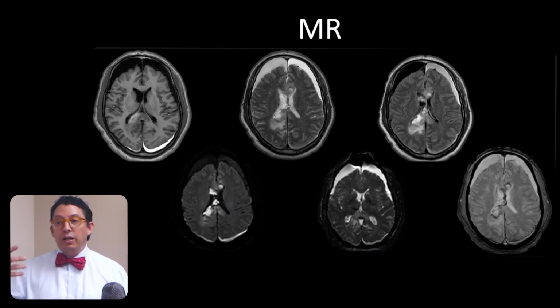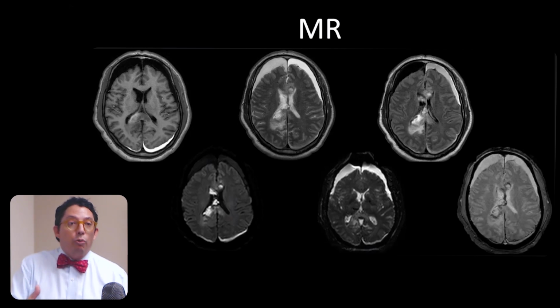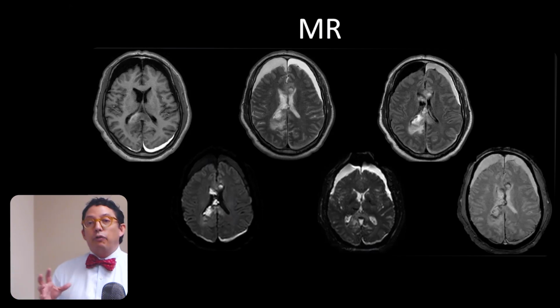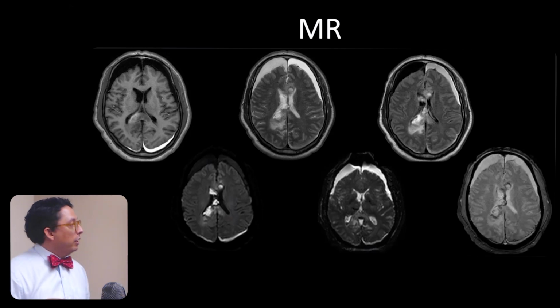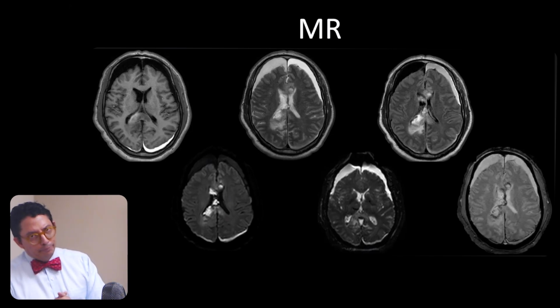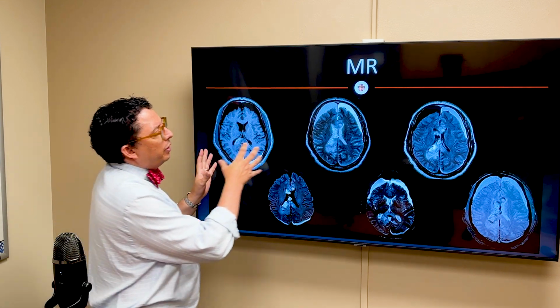When it comes to the ER, knowing of a patient that was unconscious, if this was something that happened now or was it old, or like in the case that we have here, we have different stages of blood. So let's go back a bit to our MRI introduction lecture, and I hope that you also enjoyed the basic MRI physics one that we had, where we're going to see these images.